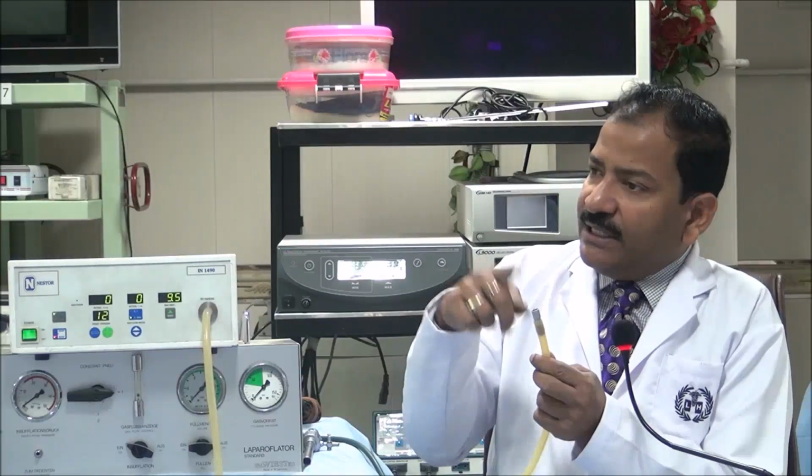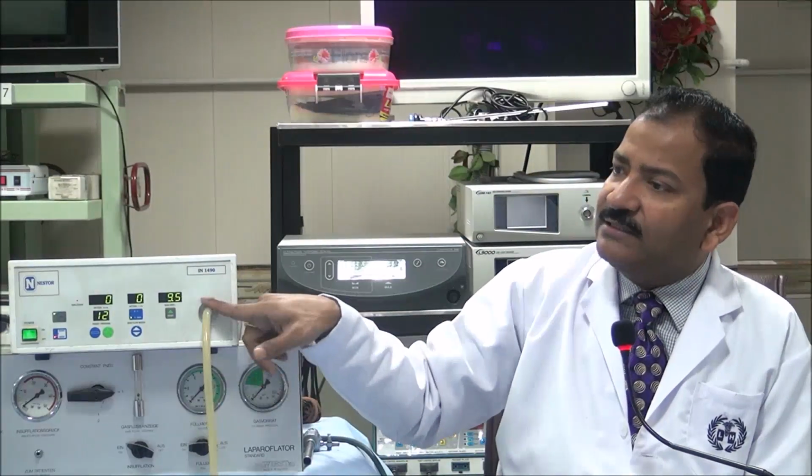One of the major reasons why an insufflator is easily spoiled is that sometimes fluid enters from this channel. If you are doing a hysterectomy, in LAVH there are two parts. One is laparoscopic, the other is the vaginal part. In the laparoscopic part, once you have finished, you remove the instruments and deflate the abdomen, but the cannula will be there, because after finishing the vaginal part you have to come back for the final inspection. At that time, sometimes we forget: the insufflator is switched off, but we forget to disconnect this tubing. And then once the cannula is touching the bowel, some blood comes and enters the insufflator.